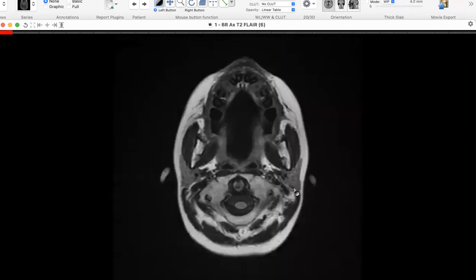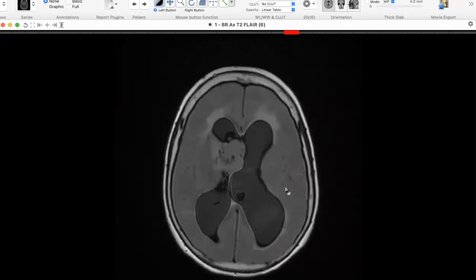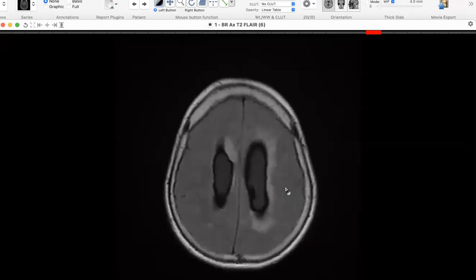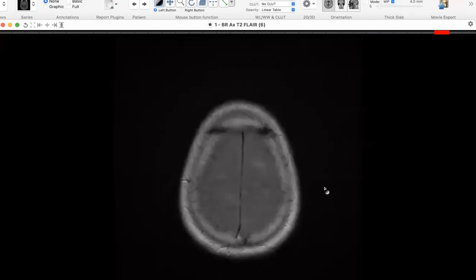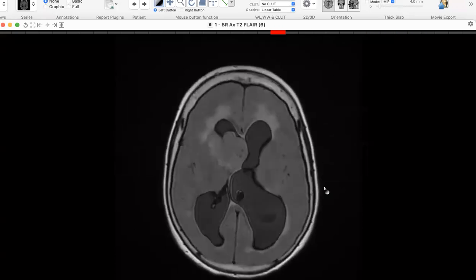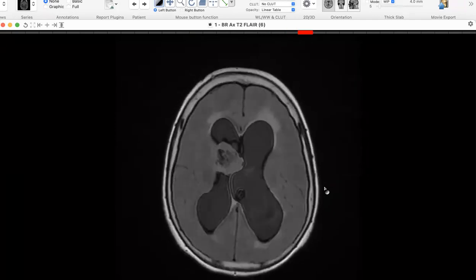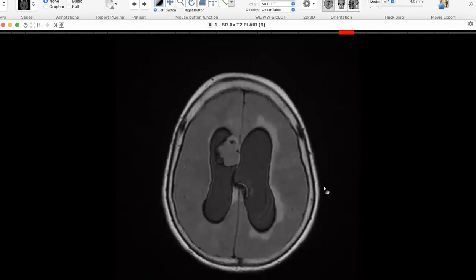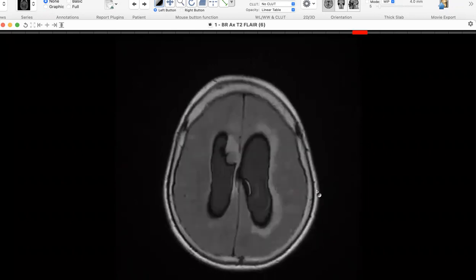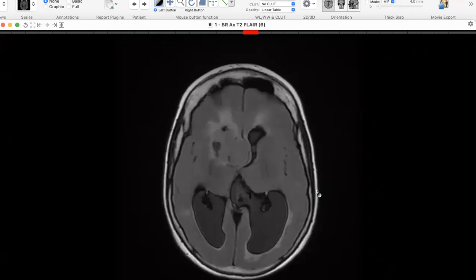So, choroid plexus lesion, and even subependymoma, ependymoma, and central neurocytoma. This is not the appearance of the subependymal giant astrocytoma. The stigmata of tuberous sclerosis is not seen. So the subependymal giant astrocytoma is not in the list. This is all the differential which I can think about.